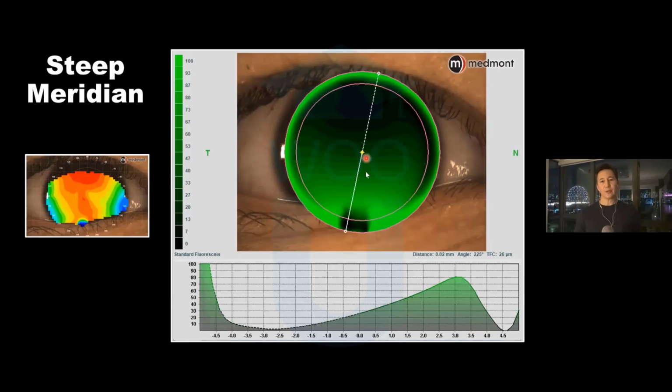But going to the vertical, where that hot spot is, notice how the system has to deal with that air at 6 o'clock that creates a high elevation, and it gives you this very bizarre pattern where the lens is landing at 6 o'clock right here and then landing just inside of the optic zone up here.